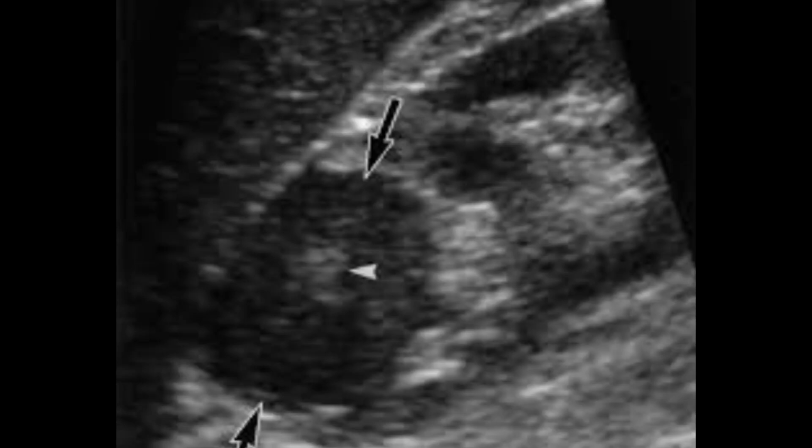Again, another example here, it is also about to breach the renal parenchyma, breach the renal capsule. It is hypoechoic, it's round in shape, and internal echogenicity is predominantly hypoechoic. In this particular case, you cannot see any pelvicalyceal dilatation, there is no compression effect, there is no internal or central hemorrhage or any necrotic changes or any calcification. So this is the nephroblastoma involving the upper pole and breaching the renal capsule.